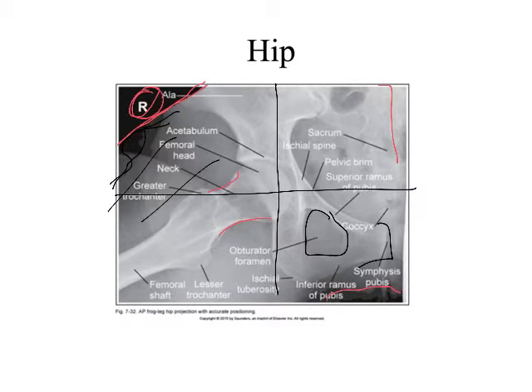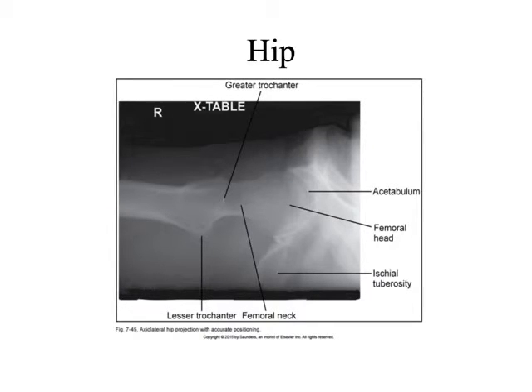All right, so if the patient presented with a fracture, we're probably going to be doing this image, right? Cross table lateral hip. Because if we suspect any kind of fracture, chances are the fracture is going to be right through here, and we're not going to want that patient frog-legging their leg out, or they may not even be able to at that point in time, right?